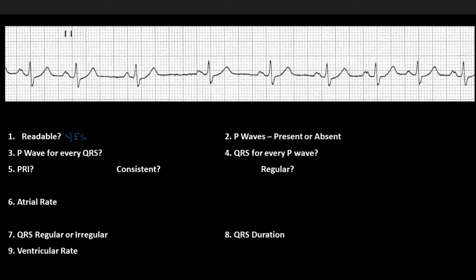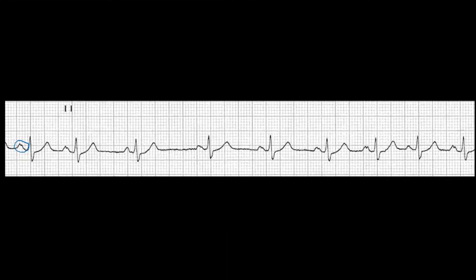Next thing I want to take a look at are P waves. Are they present or absent? So we'll just go ahead and circle down through here. And it appears we do have P waves. Okay, so we do have P waves, and they are present.